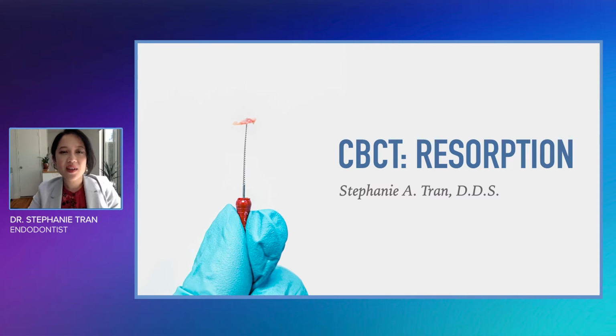In this video series, I'll be walking you through some common challenges and indications I've encountered in the field, and how I've used CBCT to help me problem solve and treat plan more quickly and efficiently, and how it can help you too. In today's video, I'm going to be discussing how CBCT is a great tool for diagnosis and treatment planning for evaluation of resorption defects in teeth.